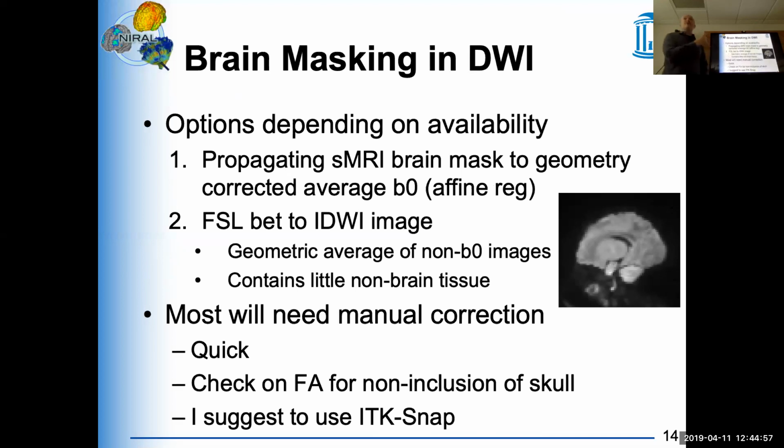Now, this brain mask does not need to be perfect. It basically just needs to tell the image where to focus when it does the correction versus where not to focus. But if you're doing the brain masking already, and you may need it later on for other stuff, sure, you can do it the right way and even manually correct it, so it's done at once. But for the purpose of QC, you can also have an automatically computed brain mask and just use that. Often that is perfectly fine. You don't need more than that.